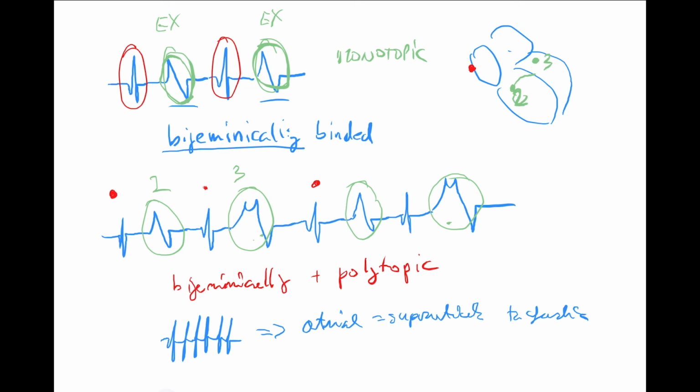If you're having 3 or more, thousands, 10,000, doesn't matter, extrasystoles which come from ventricles, so ventricular extrasystoles, like this. This is a ventricular tachycardia. Okay? So remember, V-tach or A-tach or supraventricular tachycardia. Okay? And there is a major difference in the outcome and in severity and how dangerous it is.